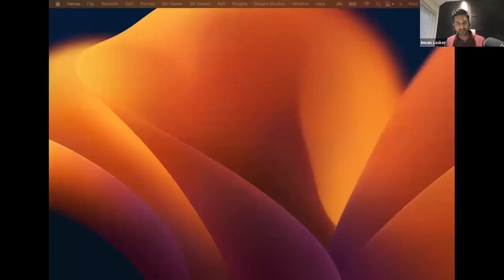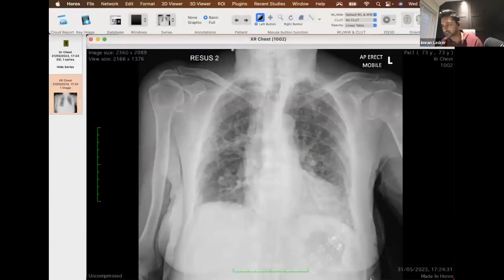Right, so let's have a look at this case. I've seen these answers. Well done. A few people went for rheumatoid. I wouldn't really go for rheumatoid when it comes to calcified lymph nodes. I would go for the other ones, unless you were saying that because of what the shoulders look like. But the shoulders didn't look like erosive changes. They look like loss of joint space.